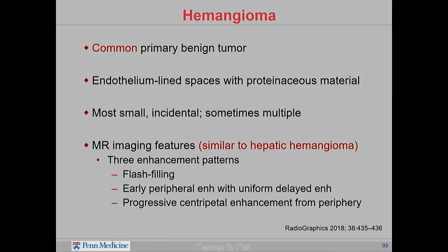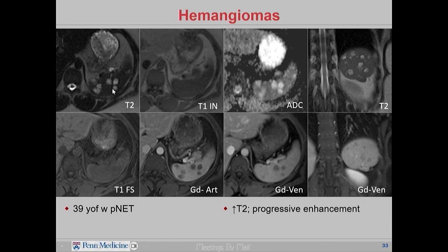Hemangiomas in the spleen are common, more common than lymphangiomas. When you see these lesions, typically they're going to be small, and they look non-aggressive. On T2 weighted sequences, they look very similar to hepatic hemangiomas. Some of the articles really say that they enhance similar to hepatic hemangiomas. I find that they typically don't, actually. They usually just show this sort of low-level progressive enhancement, but that's what's in the literature here. Not been my experience, but they're very common.